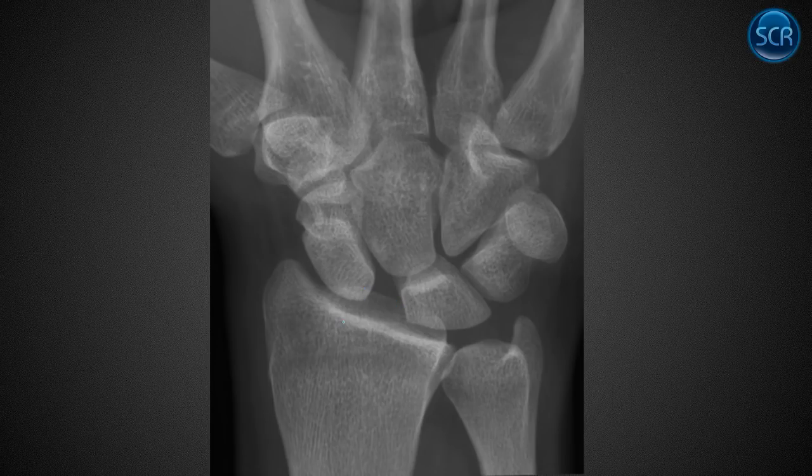So on a wrist radiograph, one of the first places you should look is, well, first look at the scaphoid, make sure they don't have scaphoid fracture. The second place, look at this joint. Okay, these are the 2 most common things. And then the third thing you want to do is look at your lateral to see if there's a triquetral fracture. And once you've done those things, you've pretty much covered your common carpal trauma injuries that are likely to show up on boards.